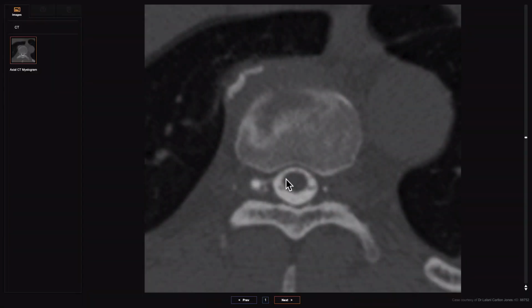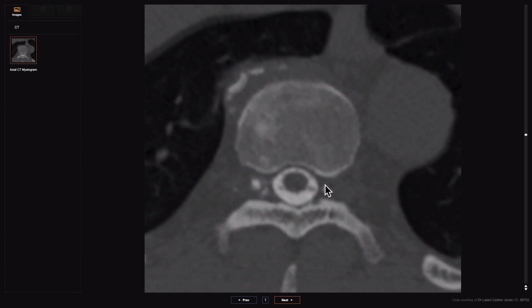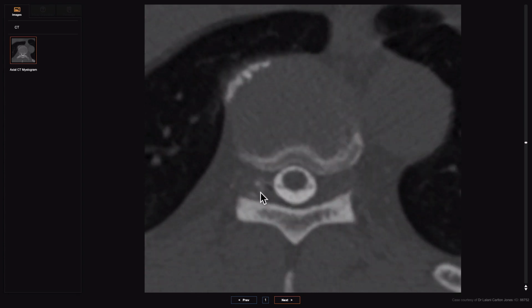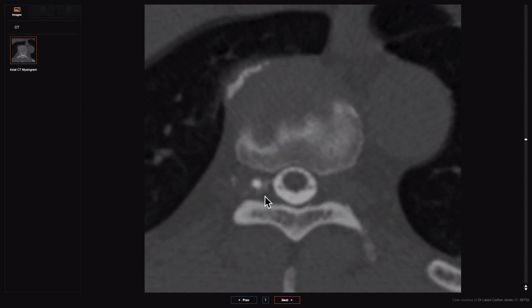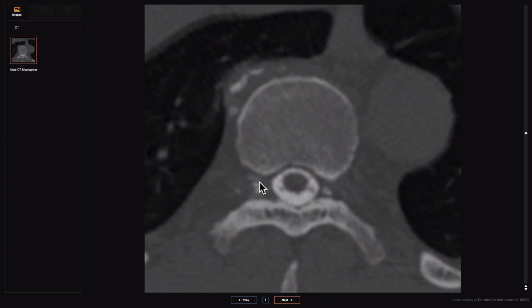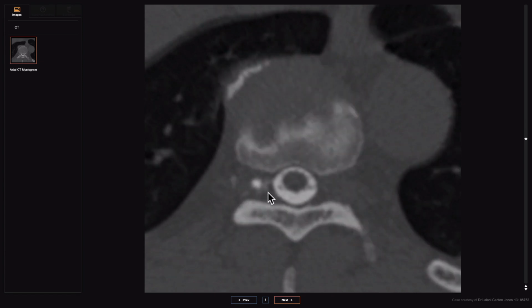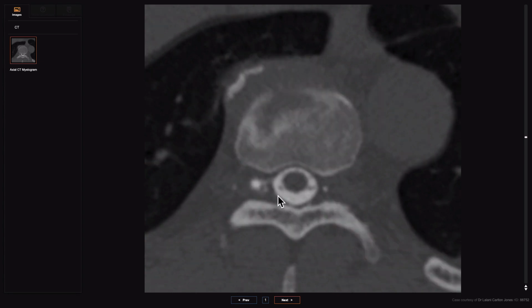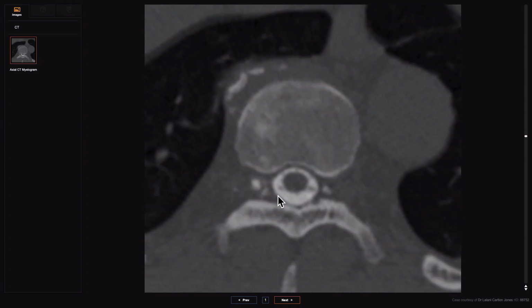So here is an example. You can see contrast opacifying throughout the thoracic subarachnoid space. You can see that it's opacifying some little diverticula laterally as well. And what you can see on the right side, which is abnormal, is all these little irregular squiggles, which are opacifying with contrast around that diverticulum. A little curvilinear structure extending anteriorly here, and then some other little squiggles that are opacifying. And generally there's a haze of opacification around this region. And this is all part of the meshwork of a CSF venous fistula that was at the right T10 level.